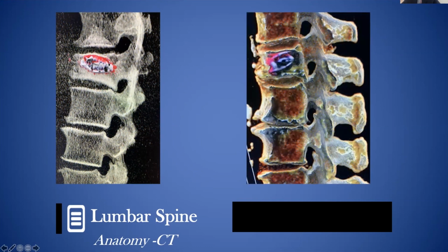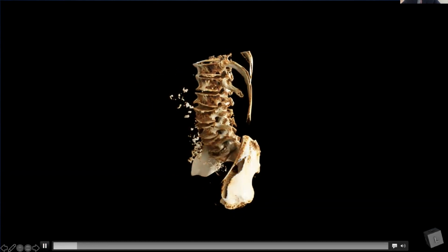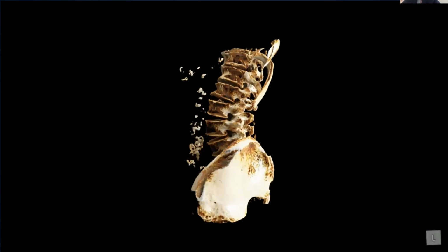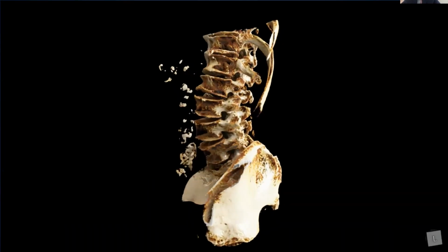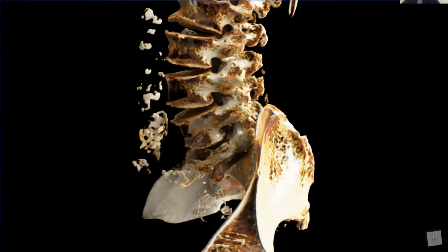This is just an example, and this is one of the cases I was going to show you guys at the end, augmenting a vertebral body with an implant and cement. Just showing you that again, we can go from the outer layers from a whole data set to depicting the 3D volume of the spine, in this case using CT.